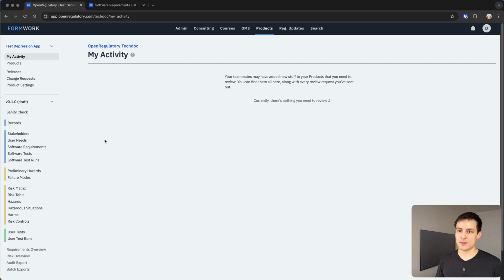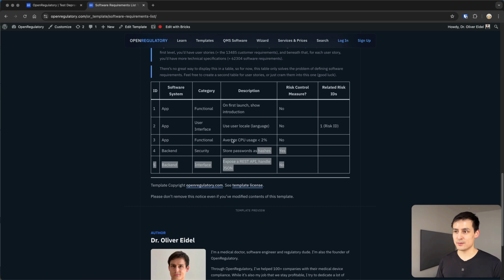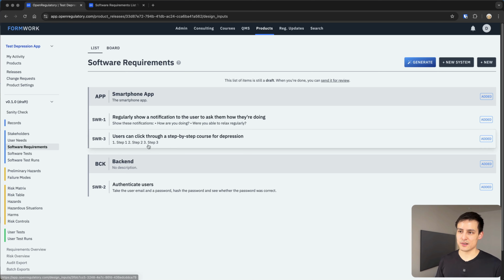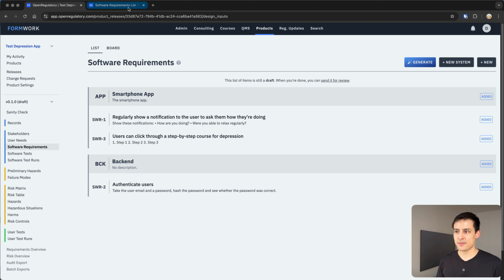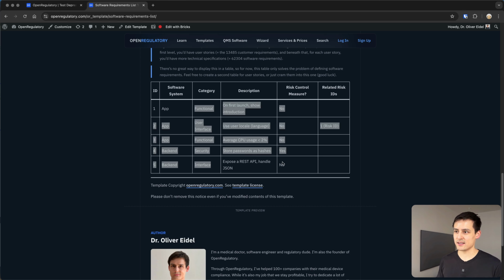In Formwork, likewise, we also had the more elegant implementation where instead of creating this terrible table, which is a gigantic mess, you can just do it in Formwork and it's nice and structured and it generates spreadsheets for you. Now, the big question, of course, is that for each of these things, we need a test. So, okay, keep this table in mind.